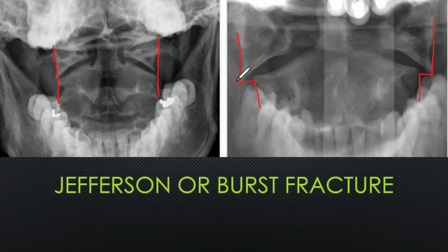Here we can see again, basically what's happened is that we've had a fracture somewhere along C1. We don't know exactly where, we can't see it here. What's happened is that C1 started to move out in that direction, so that's why we're seeing that step. C1 has now moved away and is causing a burst fracture. Conversely, this can happen with C2, so you can have this image flip. You can have a step that goes that way instead of what we are seeing here, a step that goes in that direction.